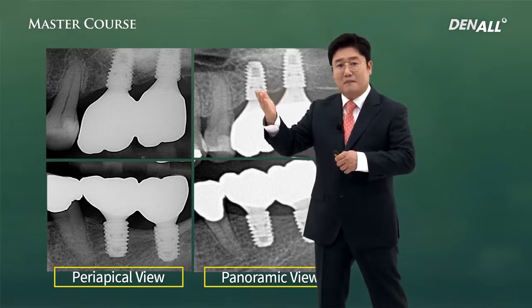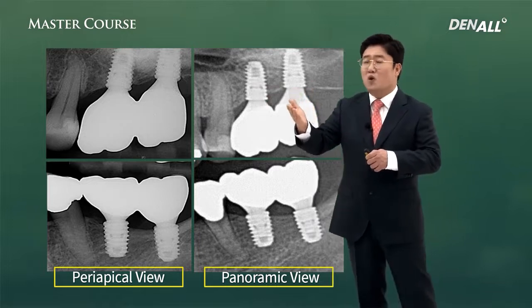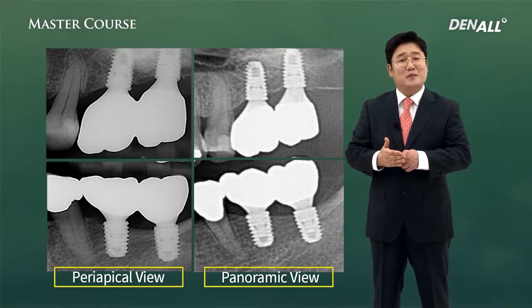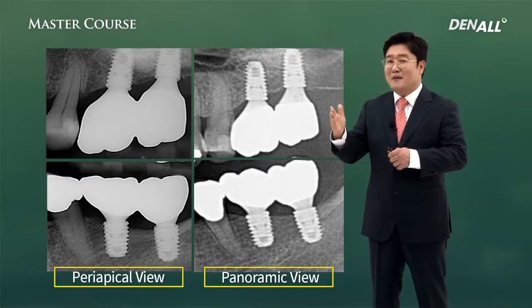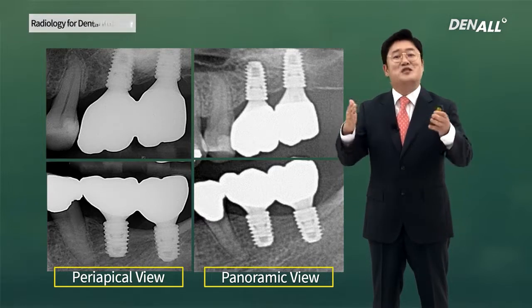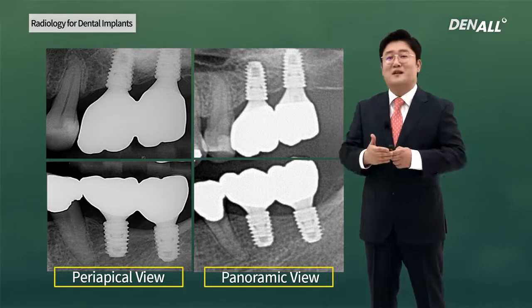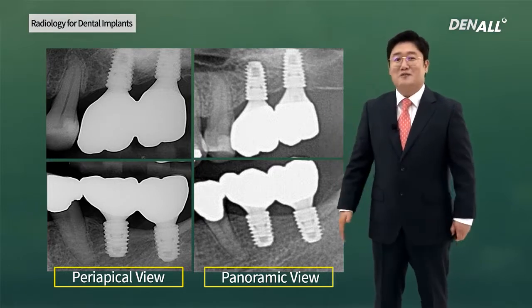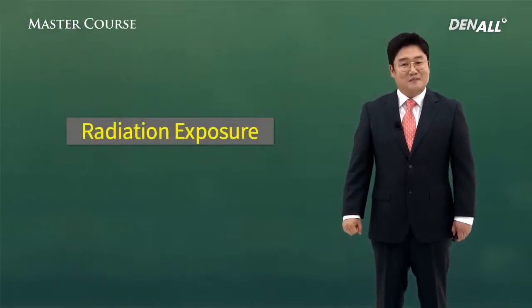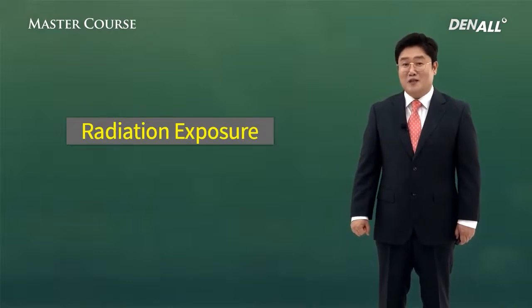On the X-ray, implant fixture images, relation to bone, teeth are shown in details and clearly. Compared to cone beam CT, the information is limited. The coverage of the image is restricted. That's something we have to acknowledge. We have looked at CBCT, panorama, and standard periapical radiology.